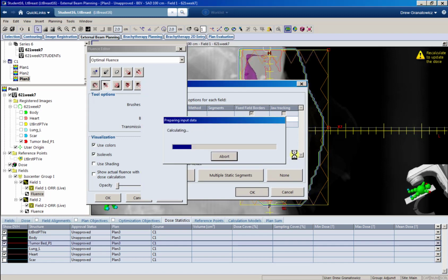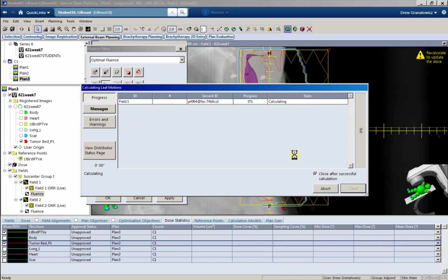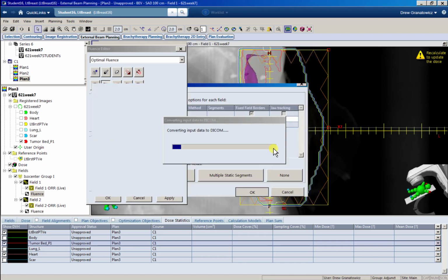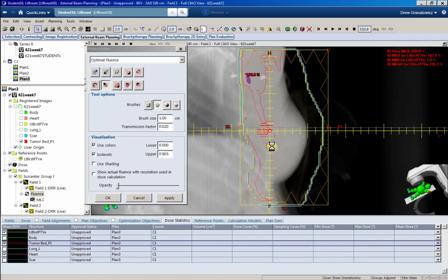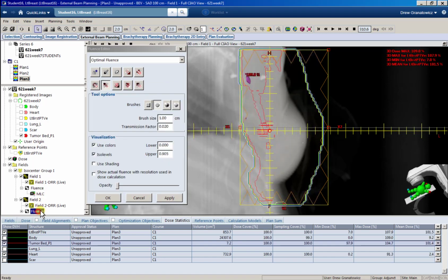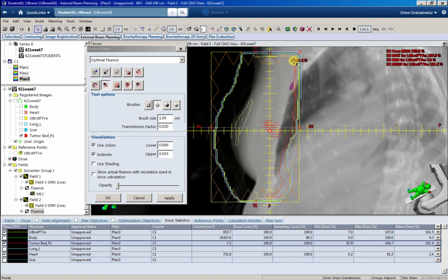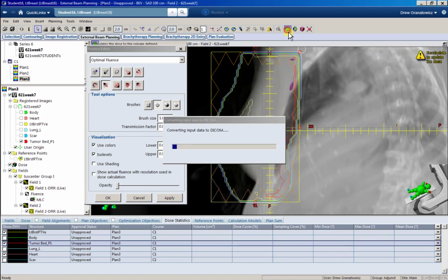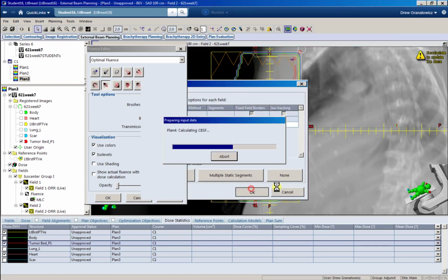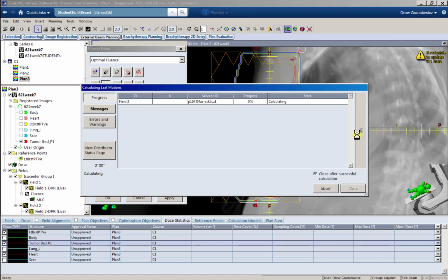I think it'll be okay. Same thing on this side. I'm going to just click over these spots twice since they're small areas but still pretty hot. Hopefully just speed this up a bit.